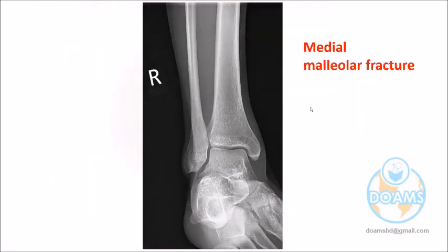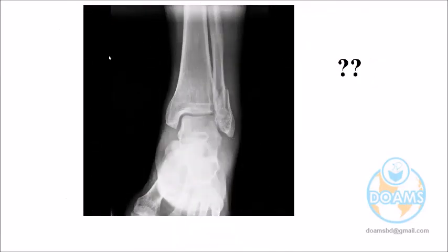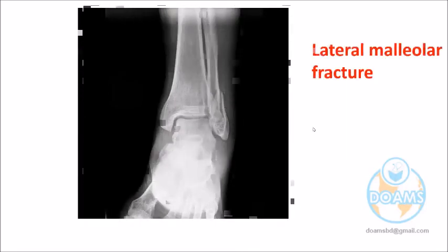And what are you looking at? Medial malleolar fracture. Here, doctor, right? Oh yes, very obvious medial malleolar fracture. What are you looking at here now? Fracture of the fibula. Which fracture? Which area? Lateral malleolar fracture.